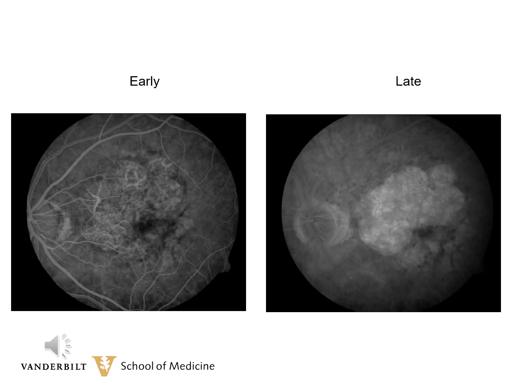Here's another comparison of the early and late phases of a window defect. Note that while the fluorescence is more intense in the late phase, the area of the hyperfluorescence does not change. And note they continue to have sharp borders. The choroidal vessels do not have tight junctions, so the fluorescein naturally leaks out of them and stains the interstitial tissue of the choroid as well as the sclera.